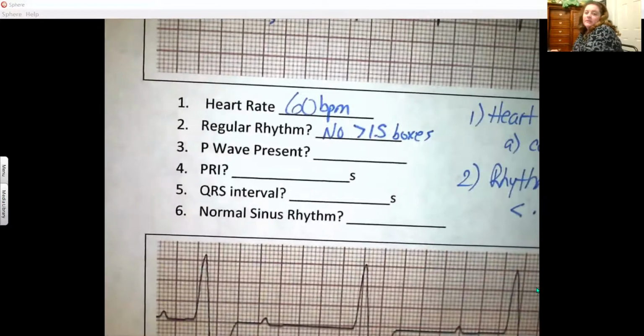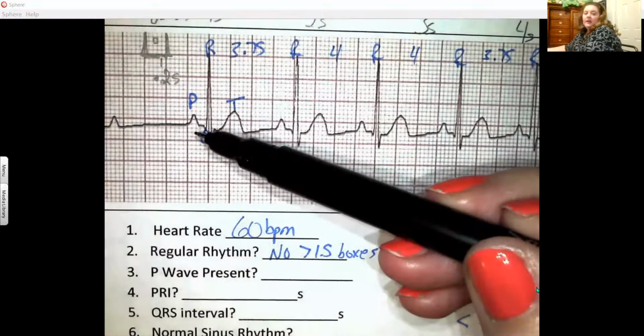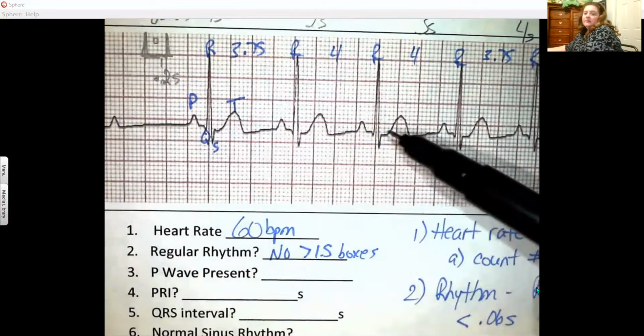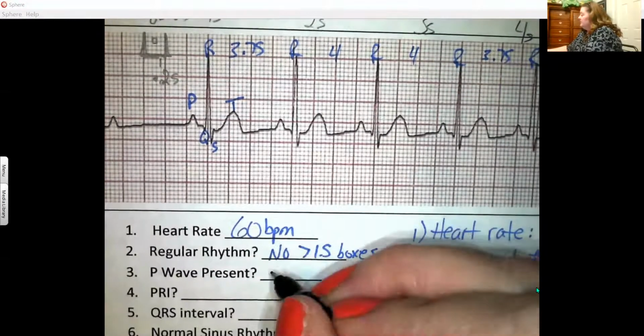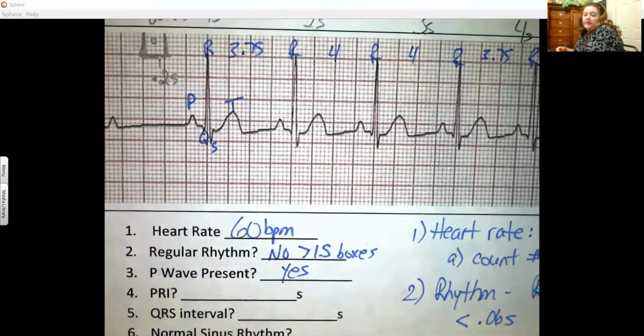Next question, super easy. Are the P waves present? You take a look at it. Can you find P waves? Yes, yes, yes, yes. There are P waves present. We say yes. Usually they do look, and I know in the video he discussed the shape of the P waves and the regularity of them. That is something that they do look for.